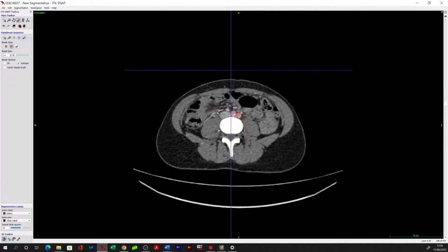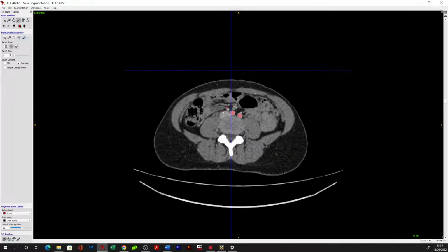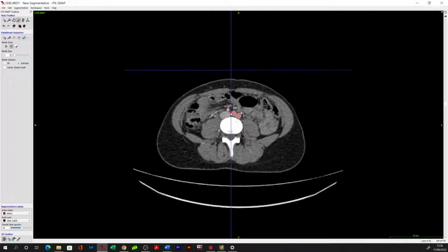I think trying to follow the vessels out to their terminal destination is quite useful. I kind of went back and forth with this. Initially, we tried to do it, and then we moved away from it. What we found is that certainly for the venous vessels, if you can't see where they're terminating, it can be difficult to differentiate which vessel is which.